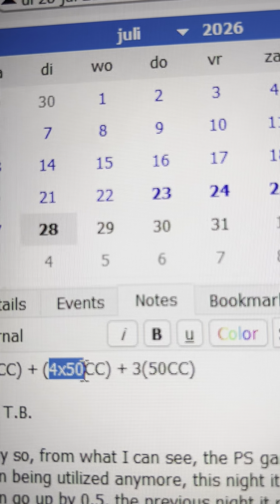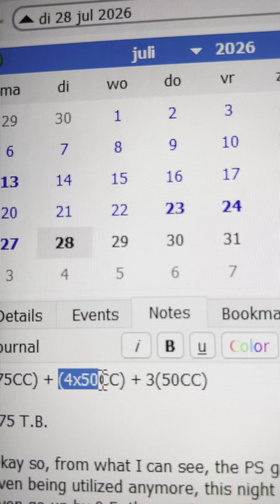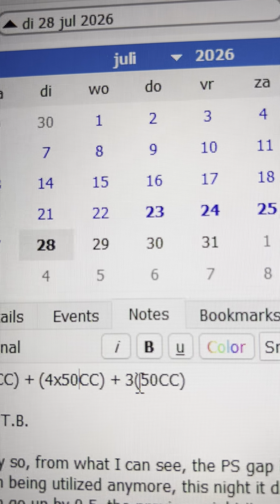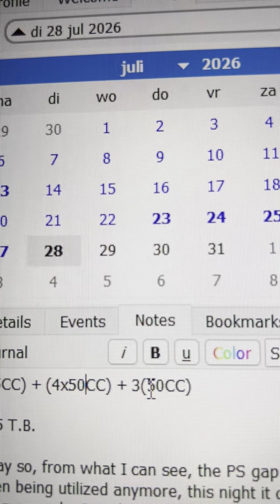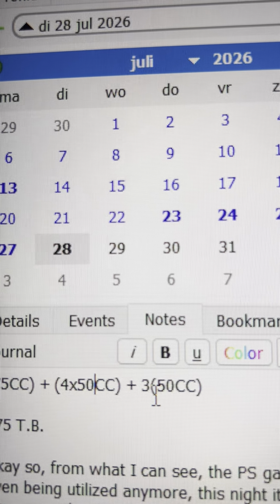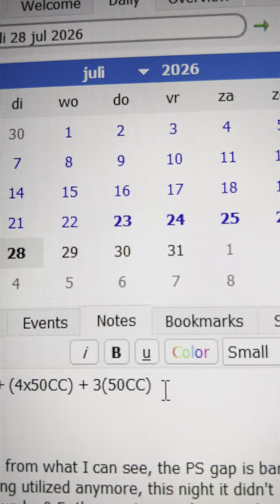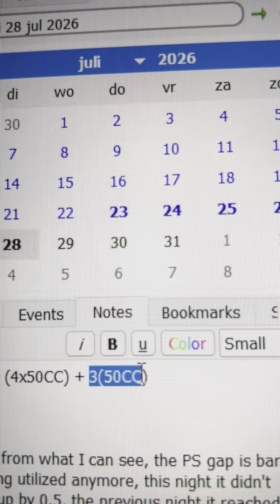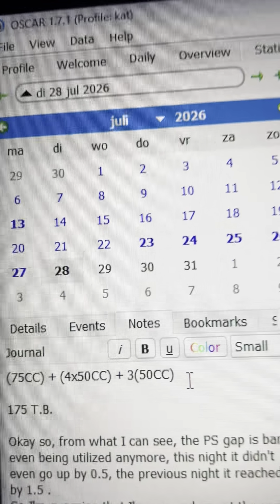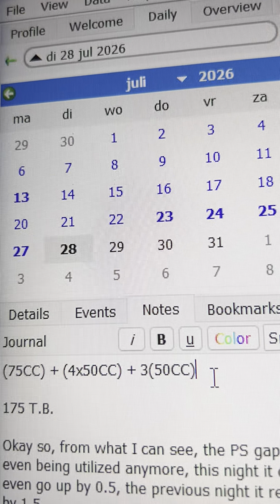And here you can see I'm using like 200 cc, so that's like 4 tubes of 15 centimeters that are 22 millimeters in diameter, I think, and then 3 tubes apart of 50 cc, somewhere around this. I'm not sure if it's exactly 50, but it's around there. I tried to measure them.